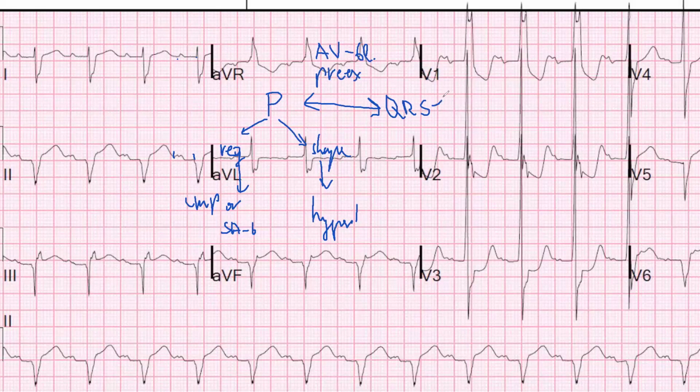If you evaluate the QRS, whether it is wide or not, yeah, it's wide. This is bundle branch block. Immediately you can think about the size, hypertrophy, and MI. This is a Q wave. This is what you can do. That's it. This is how you go through the whole system, step by step.